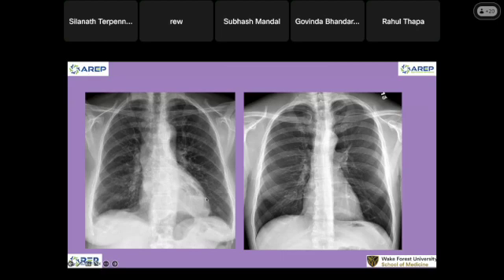And this is the thing that we think is the mediastinal mass. And actually, this right border really is not sharp. What is that structure? Okay, let me look. Right lateral border of the lung. Look at it again. Are you talking about this area? I'm gonna follow it with me, from the beginning.